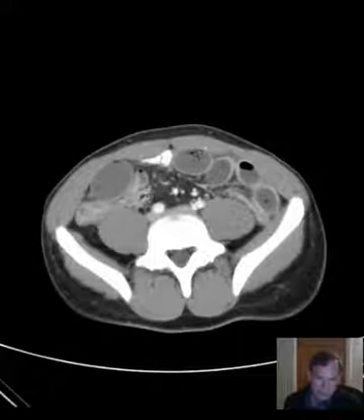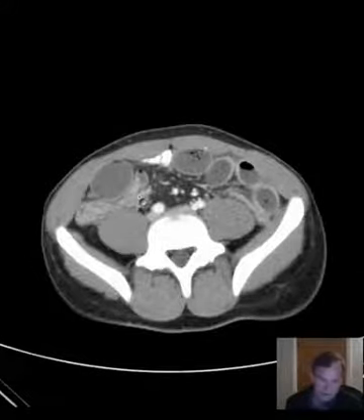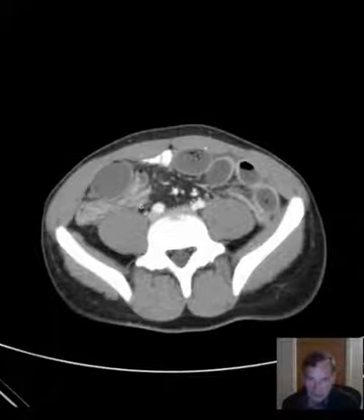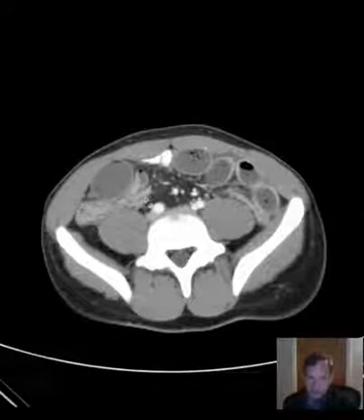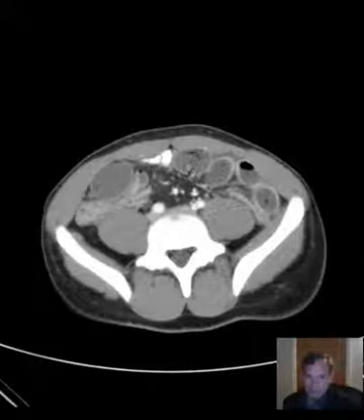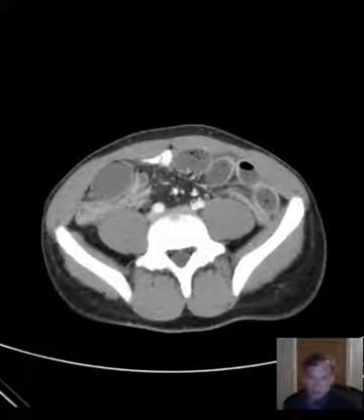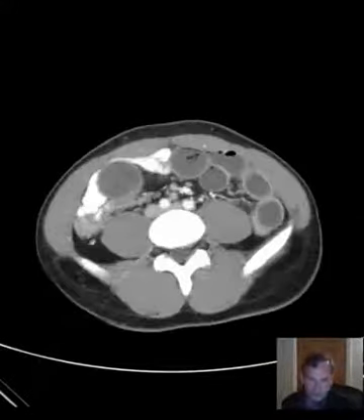We don't see it quite as well as I'd like to, but it's not distended, because this is actually a small bowel obstruction, and bowel distal to a small bowel obstruction tends to acquire an abnormally narrow caliber. It collapses, in other words. The reaction of bowel when there's a bowel obstruction is to increase peristalsis throughout the bowel in order to try to propel material through the obstruction and hopefully overcome it, and possibly even resolve it, depending on the etiology of the obstruction. But anyway, the right colon is collapsed.